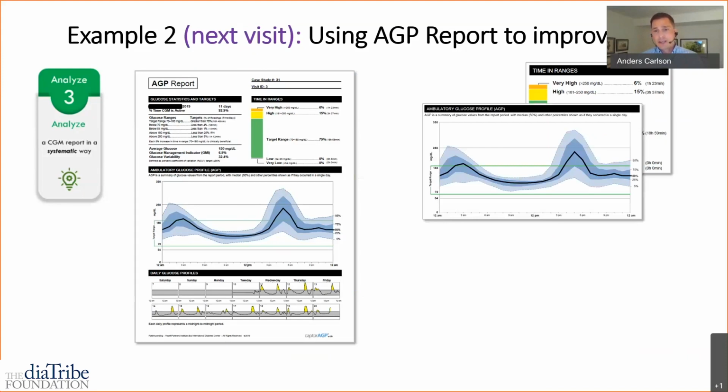And you can see here that that overnight kind of dinner peak is still there. She's still doing it a little bit, but it's quite a bit more flat. And she's certainly more flat, narrowing in range throughout the day and even in the overnight here. But there still is this fairly substantial spike at dinner time. And she really says, I've made lots of efforts to take that insulin up front before I eat. I'm doing that consistently. So that's not the issue anymore.